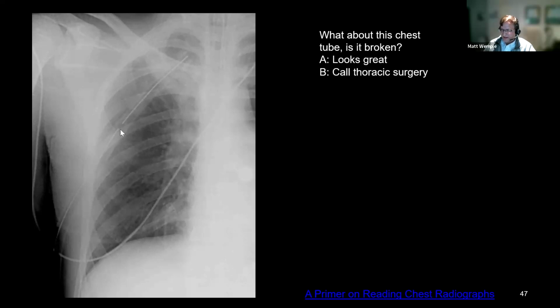But this is a surgical chest tube, and this actually is a normal part of a surgical chest tube. It's called the sentinel port, and it's basically the last port that's still actively trying to suck air or fluid, or draw air into the atrium that this is attached to. And you want this to be within the thorax. I've seen these not far enough, and if the sentinel port is outside of the thorax, it's going to cause problems for your chest tube and lead to subcutaneous emphysema that you sometimes see associated with chest tubes. So this actually looks pretty normal, and this is just all going posterior to the lung, basically. This particular chest tube.